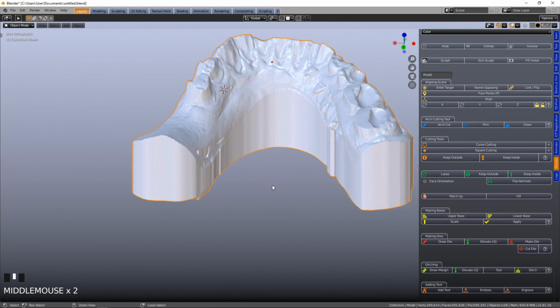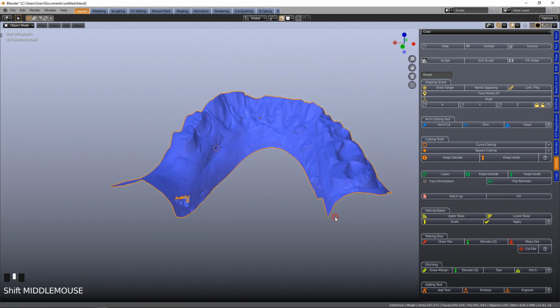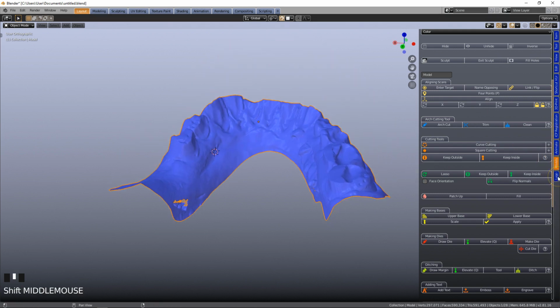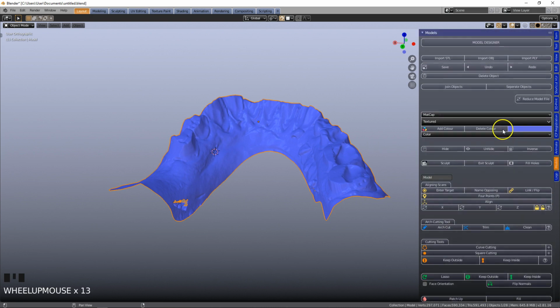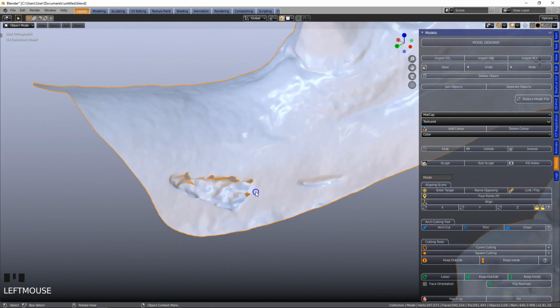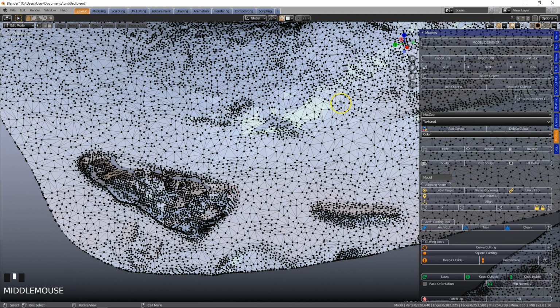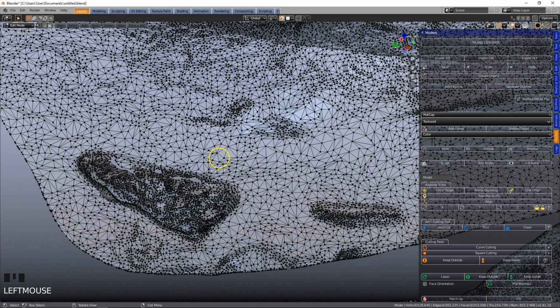So I'm going to undo it, and with the undo sometimes it depends on the steps used. So in this case it's changed the color, but we're just going to delete that. That's all good. I'm going to tab to edit, and we're going to go into transparent mode.